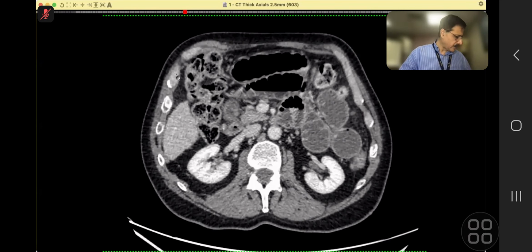Okay, candidate 1, your last case is a CT abdomen, A&E, 74 male, absolute constipation, and pain abdomen, not passing flatus, obstruction, question mark. Over to you.